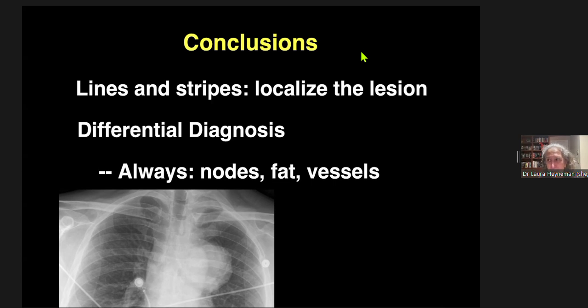If I have a lateral and it is clearly involving the anterior portion of the diaphragm, I call that an eventration. That's usually a region of muscular wall thinning, and it's much more common in the anterior diaphragm.